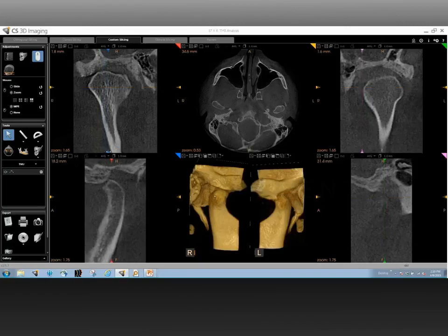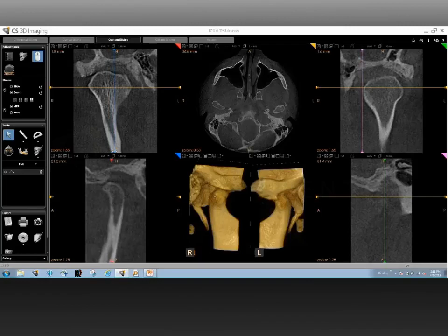If you notice, again, I'm going to stop right there, and show you some sort of flattening on the superior head of the condyle, the superior anterior portion of the condyle. Almost looks like the contralateral side. For the sake of consistency, we go back all the way to the medial pole, and just let's go ahead and stop there.